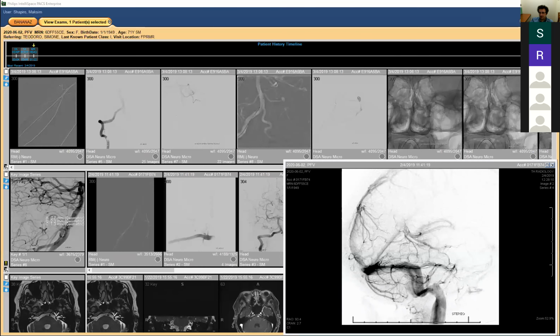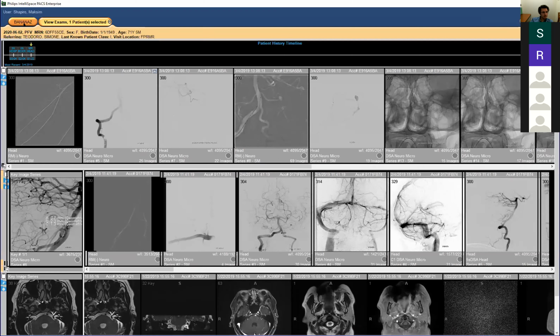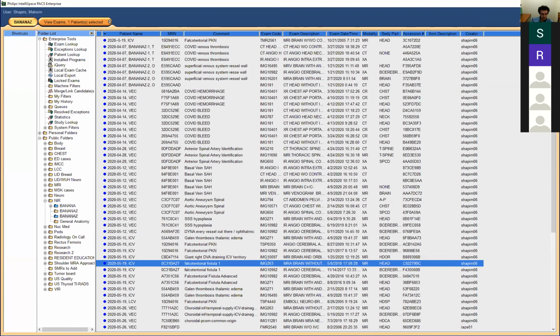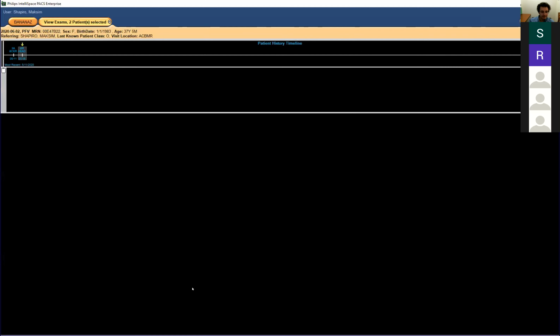Okay. So I want to show one more case. Again, we're just going to review one more case of MR and angiocorrelation. Let me see if I can find that. Okay, this one.